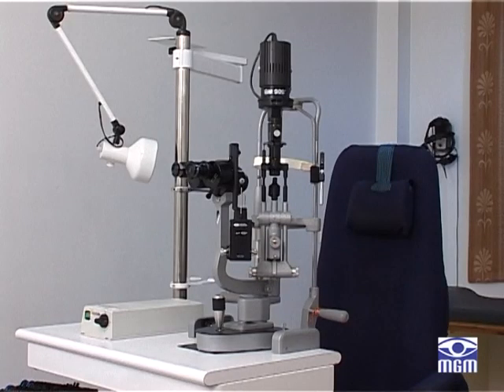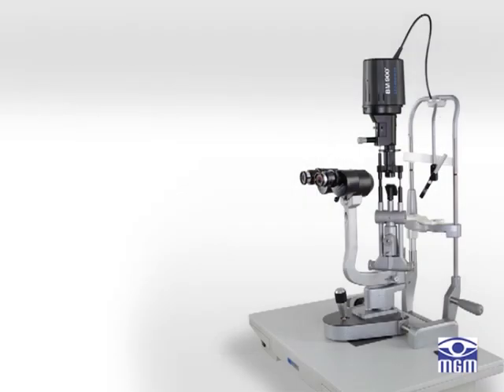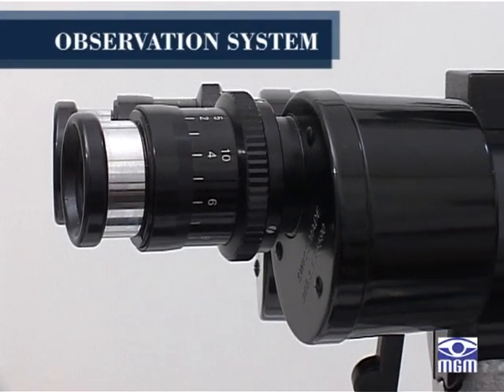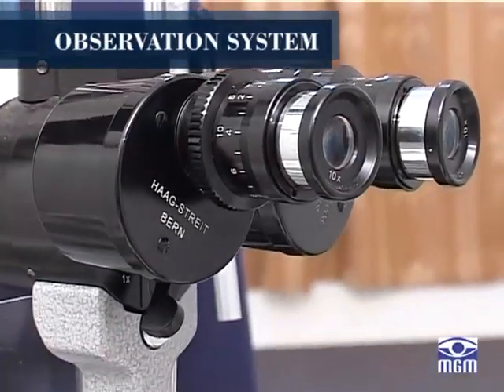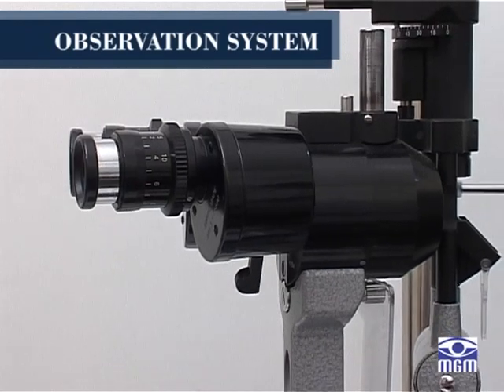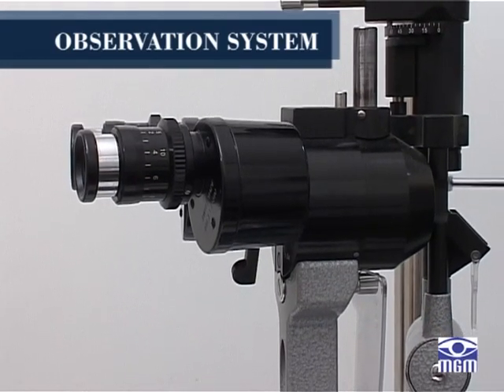There are three main parts of the slit lamp. First is the observation system, second the illumination system, and third the mechanical system. The observation system is a binocular, stereoscopic biomicroscope. This consists of a parallel Galilean telescope design.